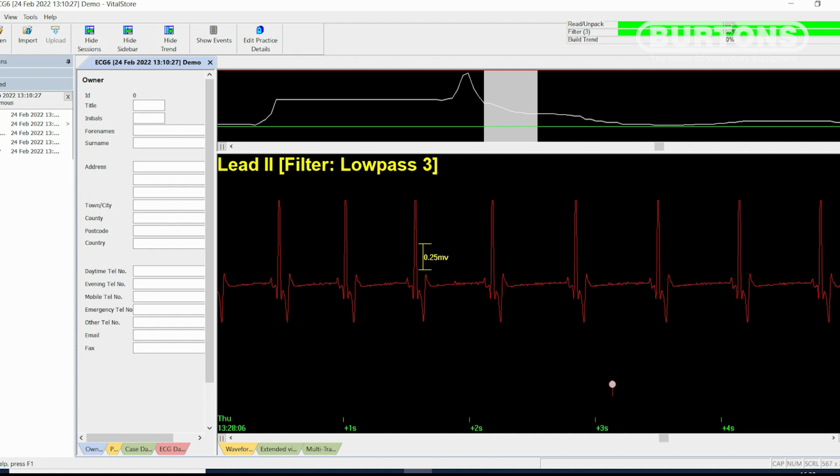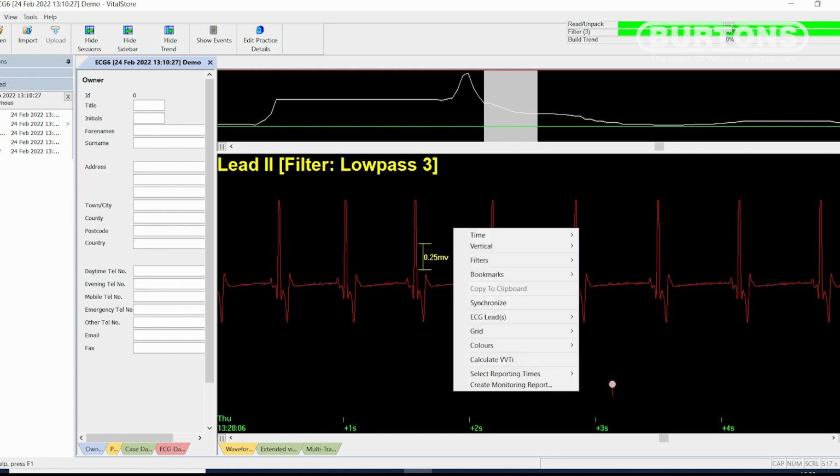So we can add events or bookmarks to the file as required and fully annotate this file for research or purposes of coming back to look at things we looked at before, whether that be just for an ECG workup or even for just a post-op assessment. What else can we look at on the ECG? So let's have a look.